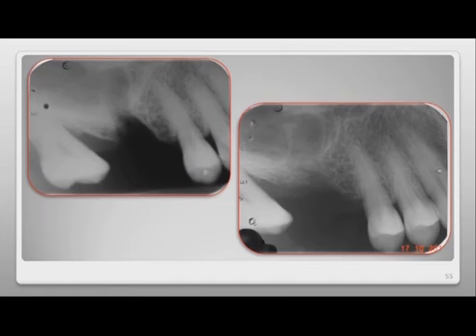And here we have the initial post-extraction X-ray of a healing wound after 2 months. When cropping the X-ray, I just took this yesterday, perhaps it would be appropriate to observe what we had at the time of extraction and lesion debridement, and what we have approximately 11 months later. This area corresponds to the root alveolus, which is perfectly obvious here, at the time of extraction, and as we can be certain, with our X-ray image, that the objective of ensuring that this alveolar area repaired itself was met.